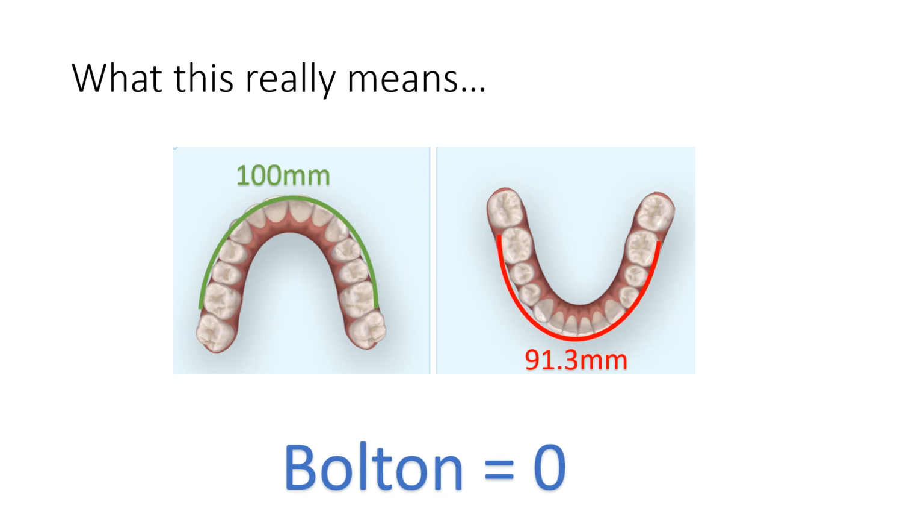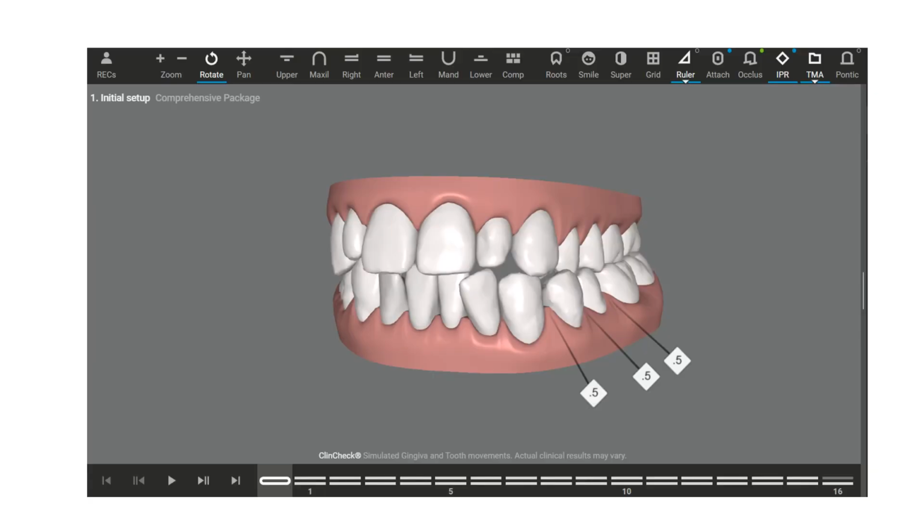So this illustrates it again with fictional numbers, but you see the concept. If this lower number were to be, say, 93, that would be a mandibular excess. If this upper number would be 102, well, that would be a maxillary excess. Again, if the numbers could be flipped so that there was an insufficiency in either arch as well.